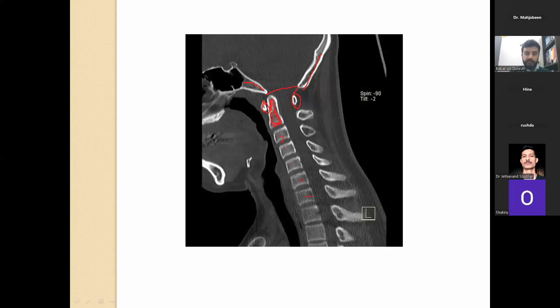At the same time, again, we have to look for this is the anterior vertebral line, and this is the posterior vertebral line. Important thing to notice here is that usually the cervical spine should have the lordosis, but here we can see the spine has straightened up, so this usually signifies there is a spasm. Again, that's why remembering the cervical spinal lines is very important. We can see here it has straightened up, which usually should have curvature.